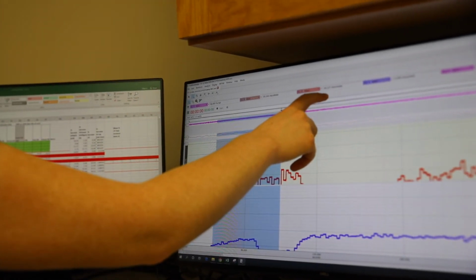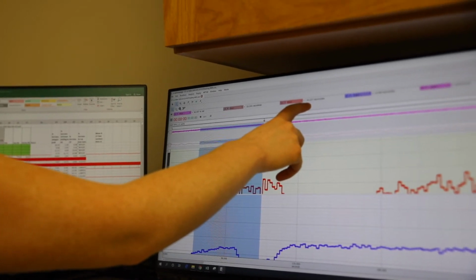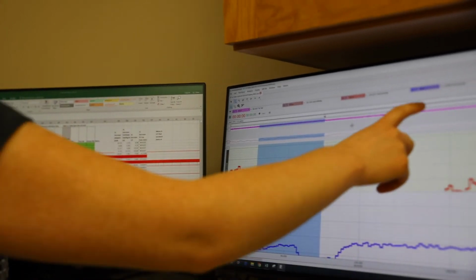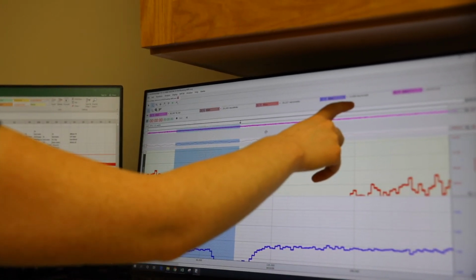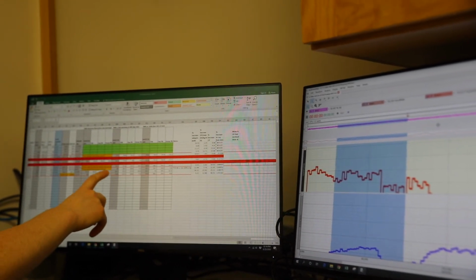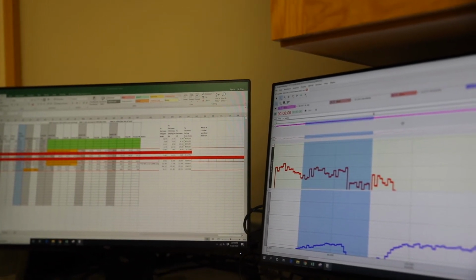For the oxygenated hemoglobin, it rounds to 29.2, so that's what gets recorded there. And for the deoxygenation, it rounds to 6.0, and so that's what got recorded here. So that's for the 60 seconds before the first warm-up.